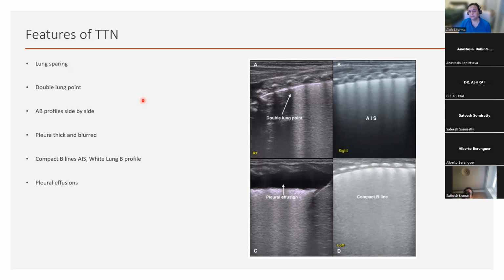Yes, please. About shred sign. There's other pathology. Can you have shred sign in, like, pulmonary hemorrhage or aspiration syndrome? Yes, very much so. I mentioned that you can see it in meconium aspiration. Early on in pulmonary hemorrhage, when your alveoli are basically full of blood, you may not see it. But later on, I would say that the inflammatory reactive cytokine release that happens with pulmonary hemorrhage can cause alveolar destruction, and because of that, you can see a shred sign in that situation as well.